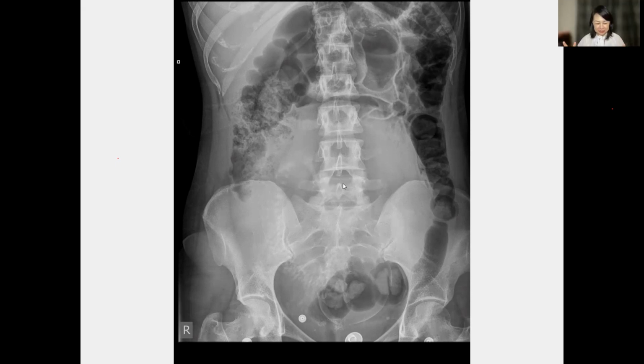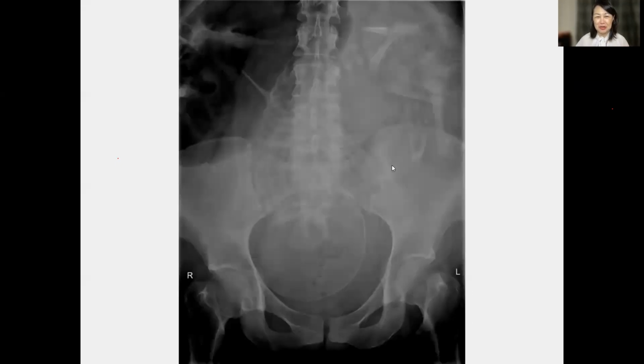Very interesting lecture. Really, I enjoyed it a lot. So this is another fetus. This is even bigger. Third trimester already. You see? This is already coming out, I think the os is open. This is scary. This is a fetus.